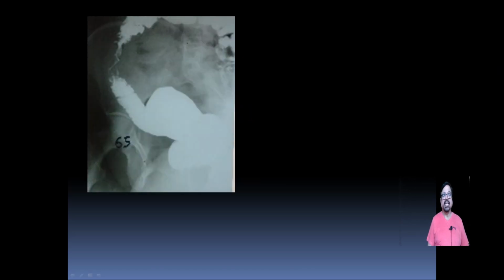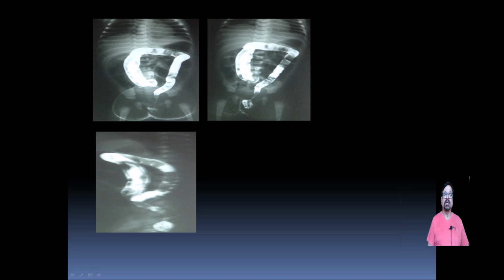Now, here we are seeing a non-distending segment. Non-distending segment with shouldering. So, top on the list, diagnosis should be malignancy. Now, these are few more cases where, as we have emphasized, you must take air in the region of pathology. Then only you can get the proper details of the mucosa, shouldering, apple core appearance, and a malignancy. Often it is important to note how much is the length involved and what are the parts involved.